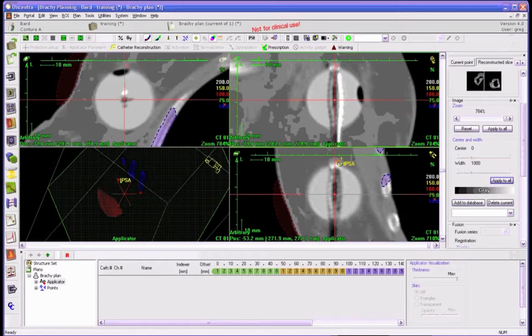Okay, now I'm back, and I'll try to move all of these to the center of the balloon and orient them so that they're along the axis as best possible, and we're just about there. For OnCentra in particular, it's important that when you orient using these windows, you make the positive y-axis, which is right here, be toward the distal end of the balloon. When you do that in OnCentra, you are guaranteed that this transverse view here, which is the ZX view, will be looking from this direction to that direction. So you're looking along the balloon from the loading side, so that the channels will be numbered in clockwise order.